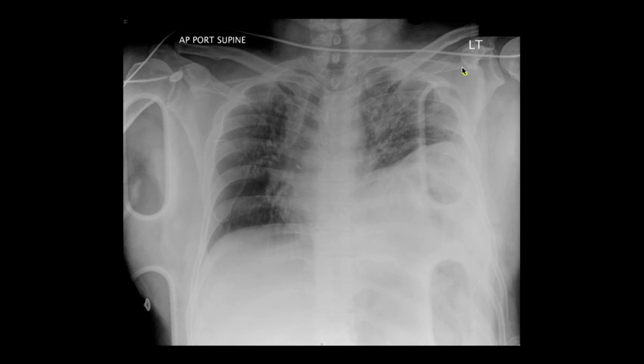In this patient, again, the patient is on a trauma board. It's a supine film. You can see the right hemidiaphragm is nice and clearly defined, and you can see that the left one is quite markedly elevated and irregular. In addition, you can see the heart shadow. We should normally only be seeing about a third of the heart to the right of the spine, and you can see that the majority of the heart is over here.